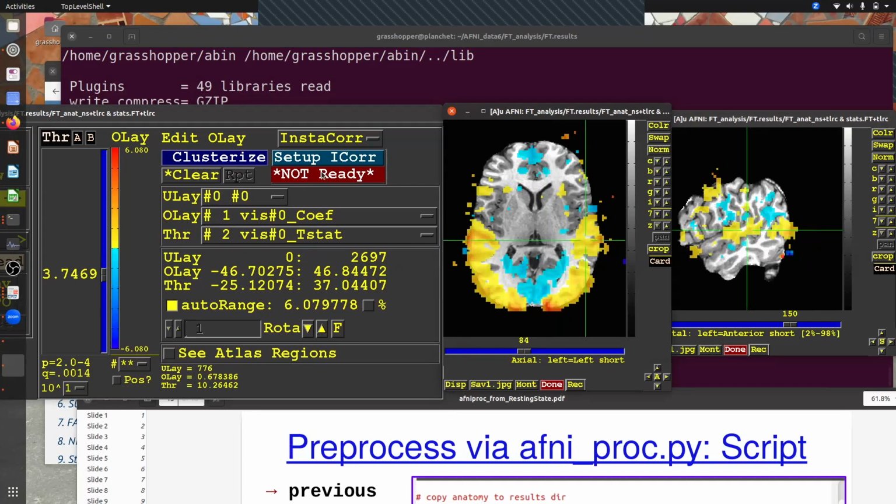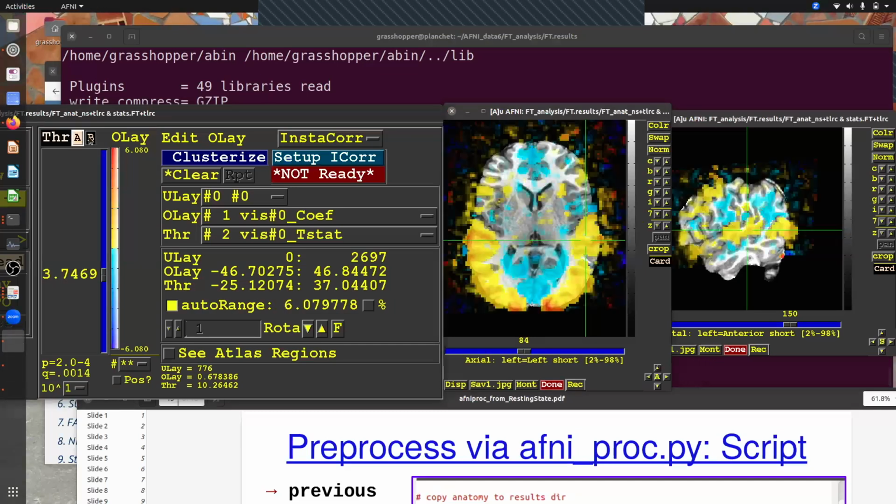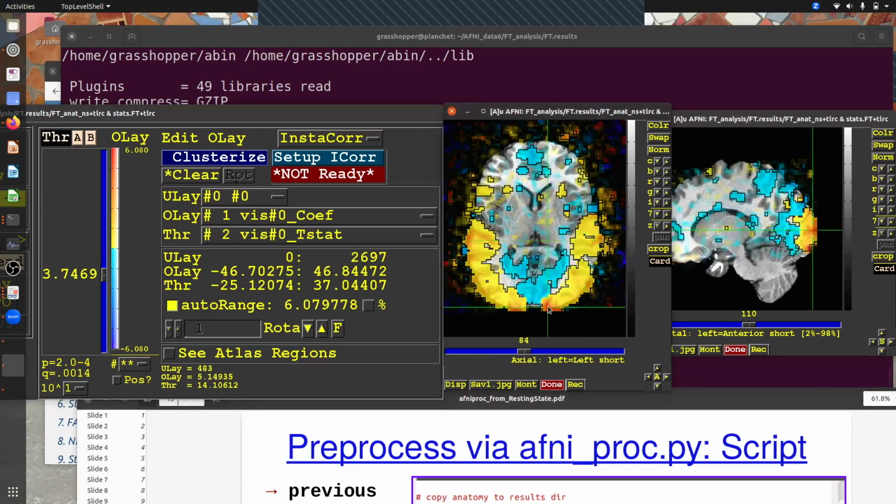Instead of seeing nothing out here, we can turn on what we call transparent thresholding. This is a nice way to make our results less dependent on the actual threshold that we're using. So we can tell if things are slowly dipping down below threshold or not.